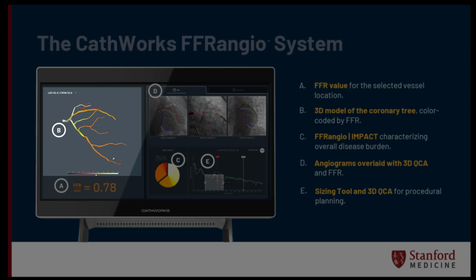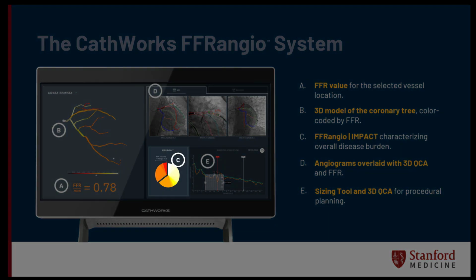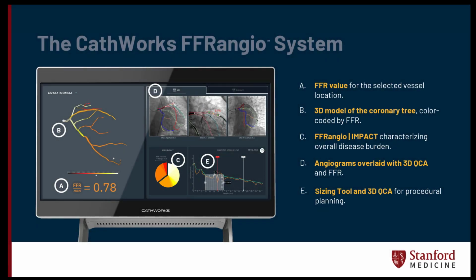You can manipulate that 3D model and drag and identify where there is that step up or step down in the FFR to help guide you in terms of where you need to treat. That color pie chart you can see here depicted by C is the impact score, which characterizes, as I mentioned, the overall disease burden and the extent of myocardium that's impacted by that abnormal FFR.